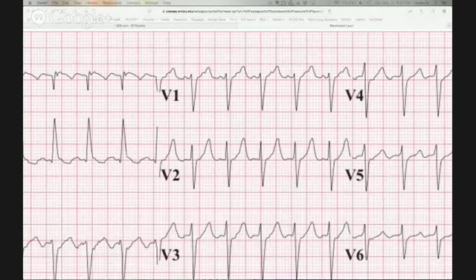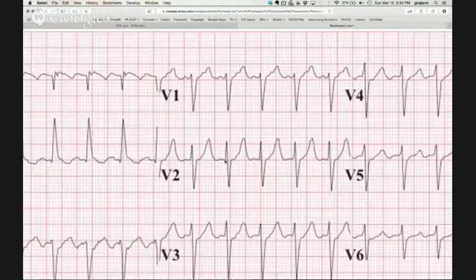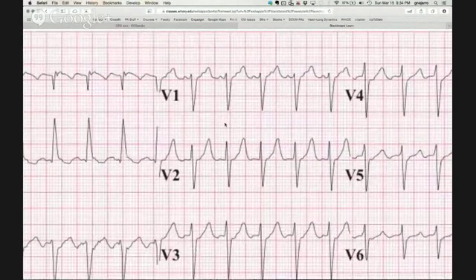So I'm looking for a QRS that has a nice, sharp beginning and end, right? This is a perfect example. Here you see the QRS starts here and it ends here. So all I'm going to do is count up the boxes. It starts right here, so we could see a line, a yellow line or a red line here. So 1, 2.5.